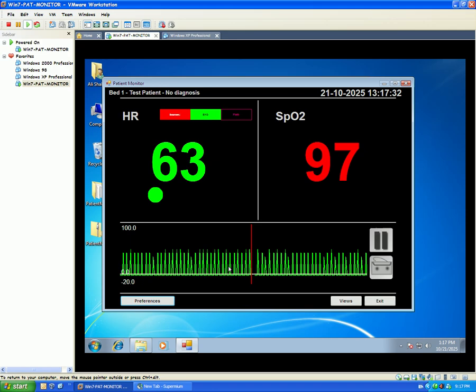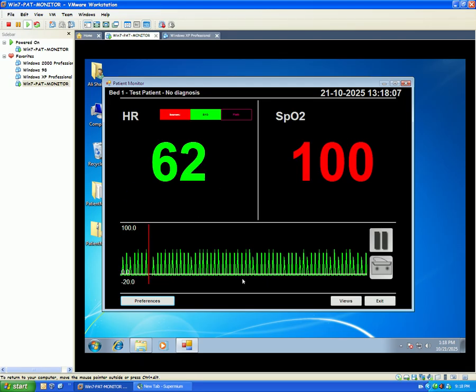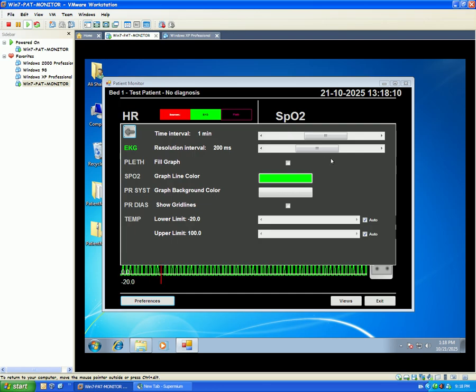This is, I think that this is ventricular tachycardia, or even supraventricular tachycardia without P waves, T waves, or other waves which are apart from the QRSs. I think, yes, this is like this. Now this is a fast heart rate, even if the heart rate is 63, 64, and it's lower, 62, other things like that.